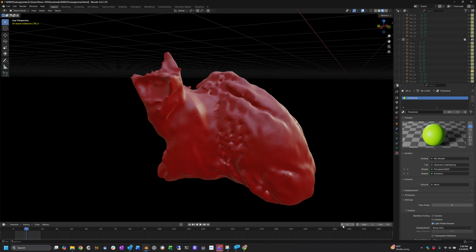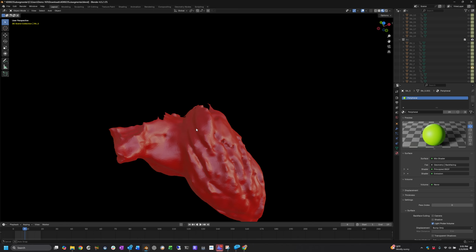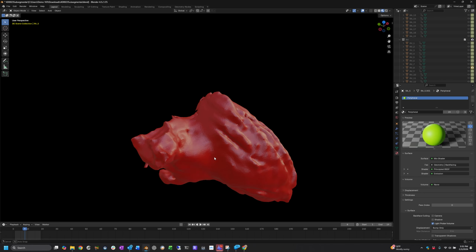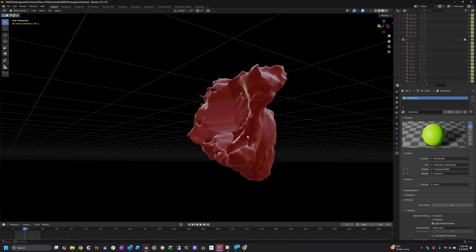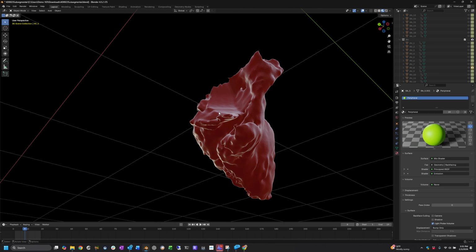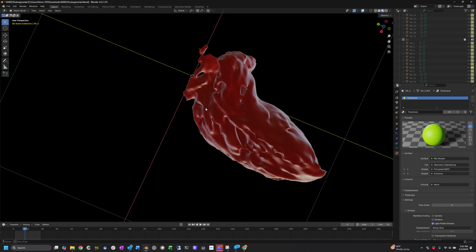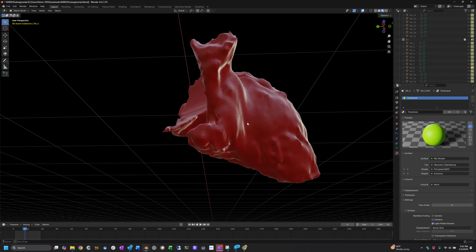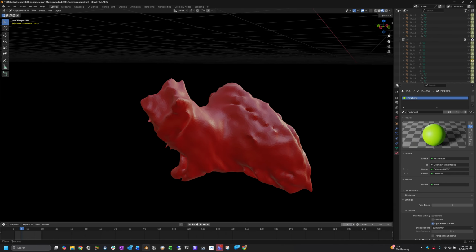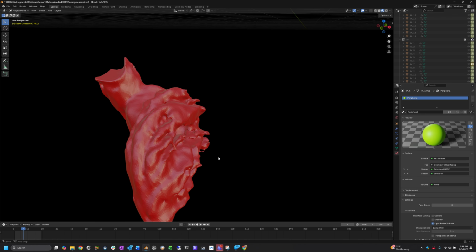And then in systole, this one looks like a little too much was taken out, but given the ratty nature of this, I wonder if that specific model wasn't looking too good, and even this one may have been an initial early attempt, because there's also some failure there. And again, here, this one is way different than the others.